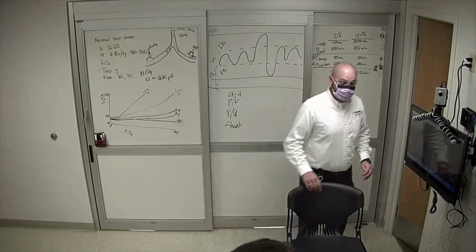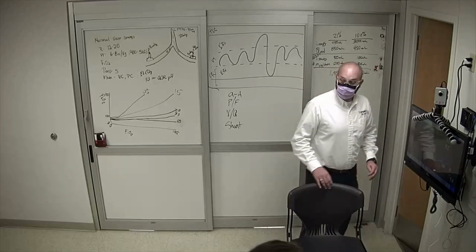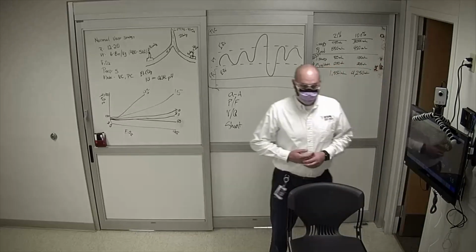Neither can I. Let's make it worse. If we wait long enough, it'll always get worse, right? So we'll just make it worse. Maybe it'll help us come up with a diagnosis. Uh-oh. Okay, so now we are peak pressuring and not delivering the volumes anymore.